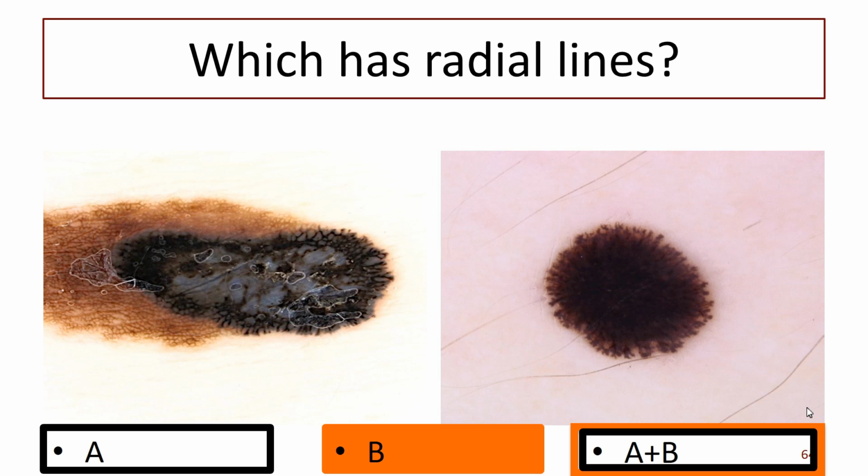So they're only partial. Let's have a look at the diagnosis. This one has radial lines all the way around, which makes a symmetrical pattern, and this has them around somewhere: asymmetrical. And looking at this lesion, can you hazard a diagnosis for me? Go on, be brave. This is a melanoma. No need to be concerned. You can be confident. So this melanoma is interesting.